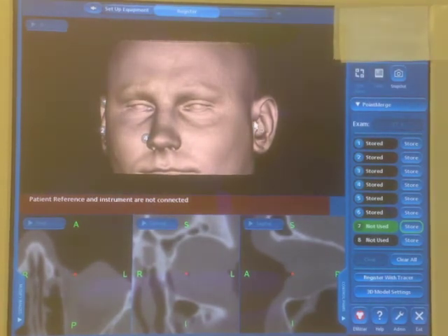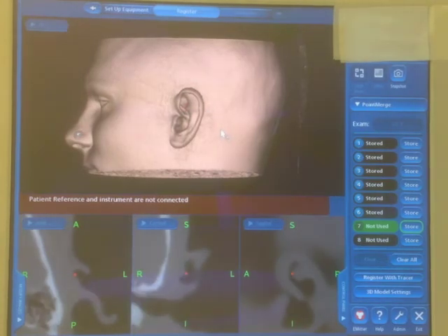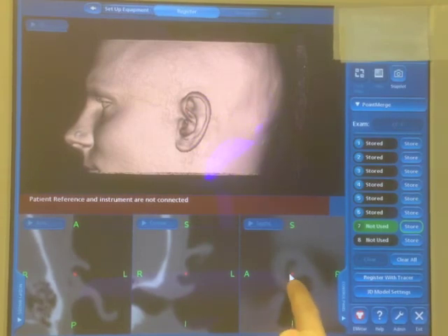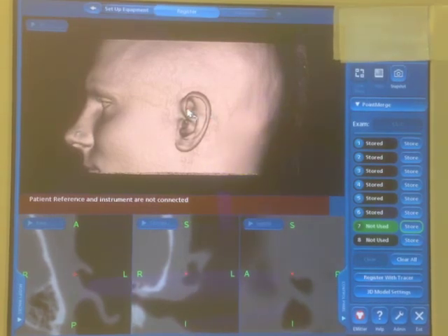Now I'm going to go back to the ear, and here we reverse them because we're always going to go top to bottom, just because that's our convention. You can do it however you want, but you always want to make sure it's the same every time. So again, I'm going to march up the inferior crus on the sagittal, but I'm watching the coronal until the helix becomes solid. Alright, so now it's fairly solid. I'm just going to pick that point. I can double check to make sure it's correct right there.